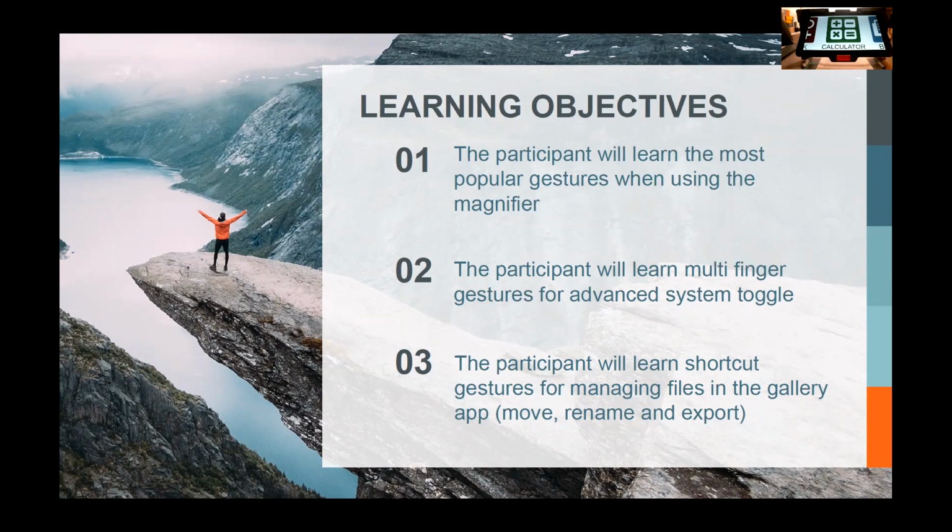Press and hold one finger on the screen will take a capture of your document automatically. You also have the option of doing a double tap on the screen, which will enable or disable the autofocus so you can do manual tasks underneath the device. So we've done a lot with the magnifier. I think that's the priority number one application, the go-to application that you're going to use. So I feel that was very well covered.